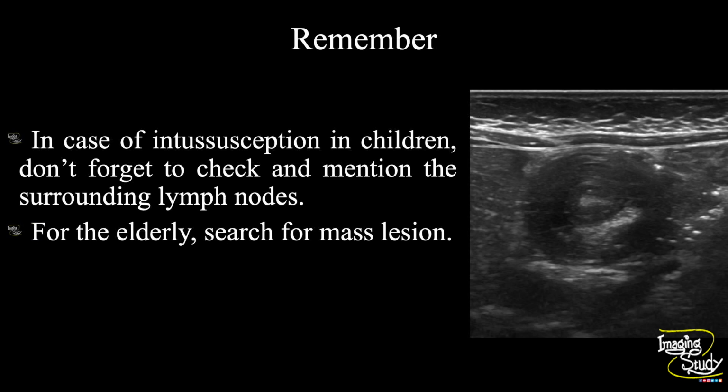Now the take-home message. In case of intussusception in children, don't forget to check and mention about the surrounding lymph nodes, as mesenteric lymphadenopathy is the common cause for this condition. For elder patients, don't forget to search for mass lesions.